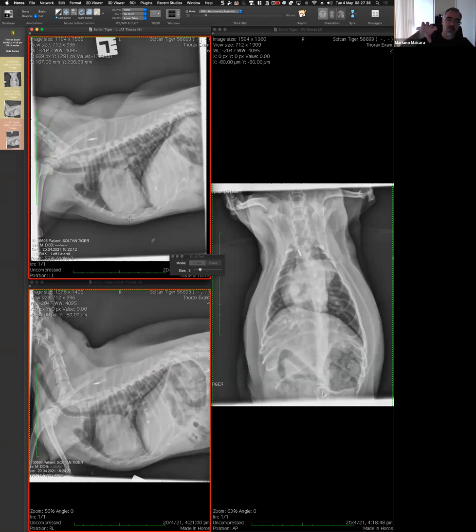So out of all the features of hepatomegaly, which are displacement of the stomach, I think that's the most important. Then the rounding of the contours, that's another one. And then the extending caudally to the rib cage. If it's there, it's mild. Makes sense? It's not as severe. It's a question of a rounding. I probably in an older dog don't pay too much attention to this much caudal extension from the rib cage. Maybe other causes, and more than anything, the gastric axis being in the right place. So then, yes, maybe they are not super strong findings.